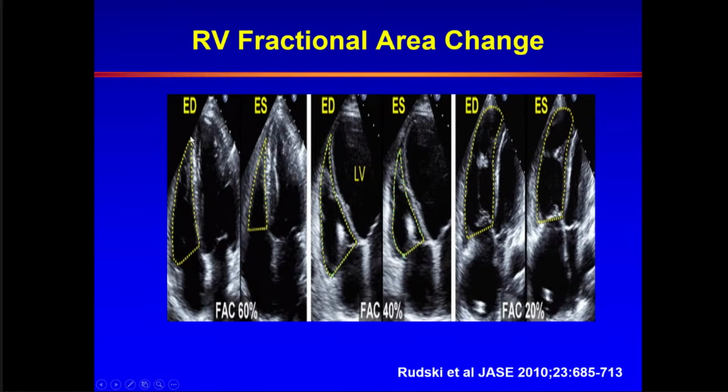Is the apex well visualized or not? Are the endocardial borders clearly seen or not? Also, you need to exclude the papillary muscles and the trabeculae. These become parts of the cavity. As you expect, it's not a pure metric of contractility, but is also affected by loading conditions.